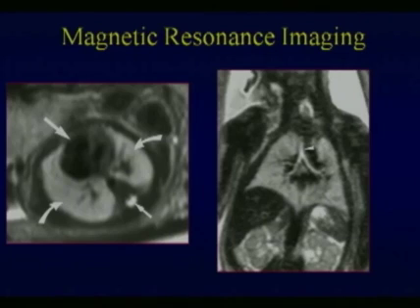They show up as brighter structures on most imaging, and again we can see the normal trachea and airways as well as the lungs themselves, and we can also see the vascularity. So a lot of information about the lungs and thorax with MRI. The major advantage is the superior contrast resolution of MRI, and so it can be quite helpful with lung abnormalities.